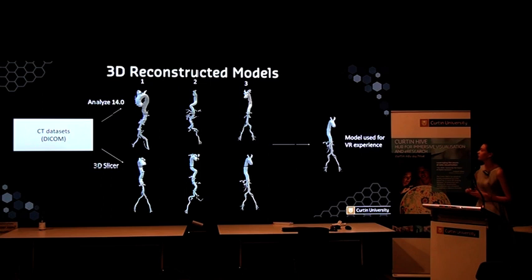So the 3D reconstructed models: I took those CT slices, which we call DICOM data, it's just the raw data, popped it into a program called Analyze 14, and the models up the top are the ones that were achieved using that software.